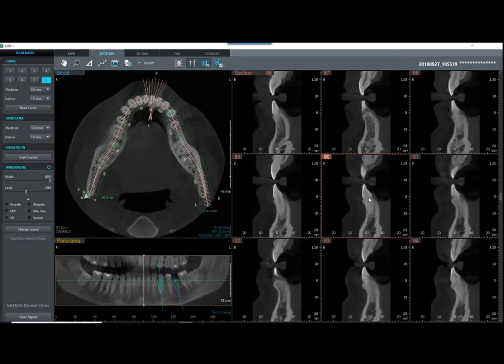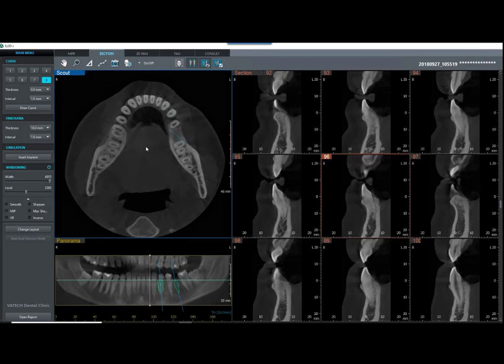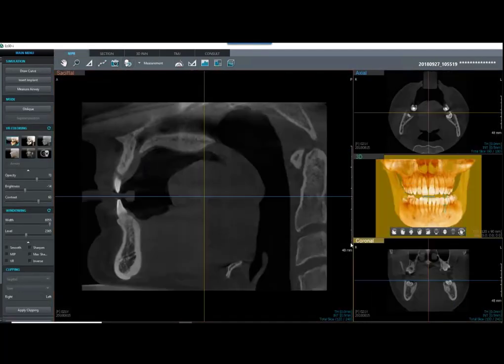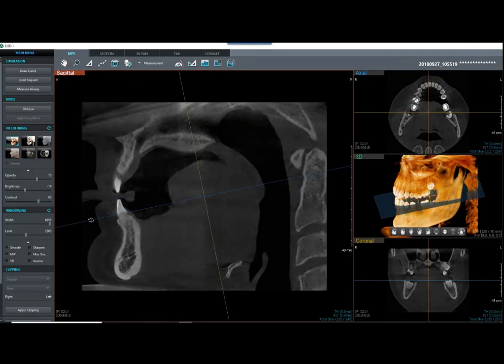Okay. How do you draw a curve in a thin and atrophic jaw? Really, if I scroll up or down and you need to find that ridge, I'm just going to scroll lower, further inferior, or higher. What we could do here is let's do our reset. And I'm going to turn this to the left. And now if I go to my axial slice, I can look at my blue line here. So look what happens in my 3D window if I rotate this to follow the angle of the mandible there.